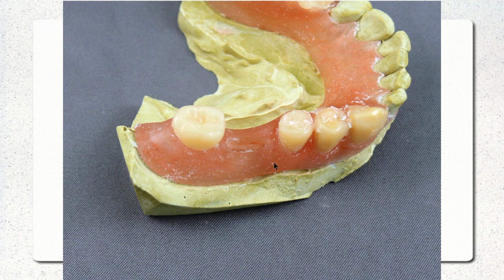And so I want to talk about repairing. All my pictures are pretty much of repairing Duraflex. The cool thing about VisiClear and doing it in a framework is you have an acrylic saddle. So if there needs to be a reline, the doctor could do it chair side. There's just acrylic there. It'll adhere right to it. If they need to add a tooth, they can usually attach to the existing acrylic that's nearby.